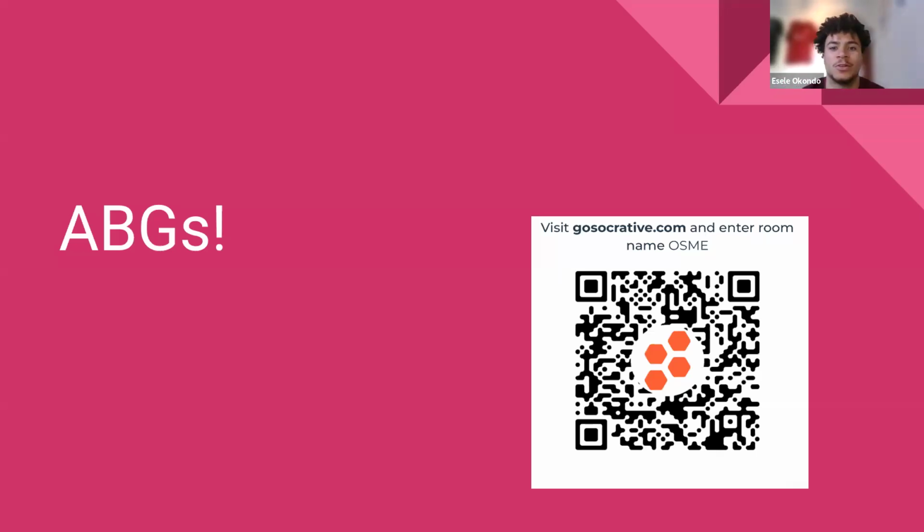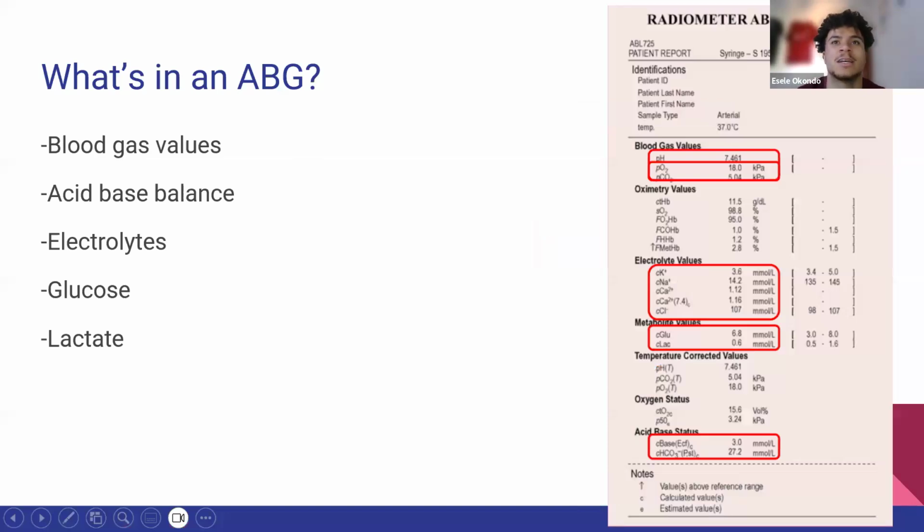So, of course, on your ABG, you have a variety of bits that you'd want to look at, depending on the reason for doing the ABG. Yeah, type one or type two respiratory failure, very good. pH, PaCO2, PaO2, and bicarb. Yeah, all very good points.